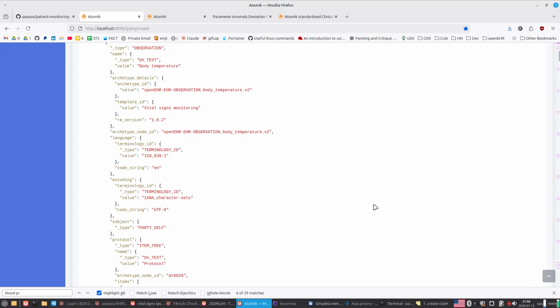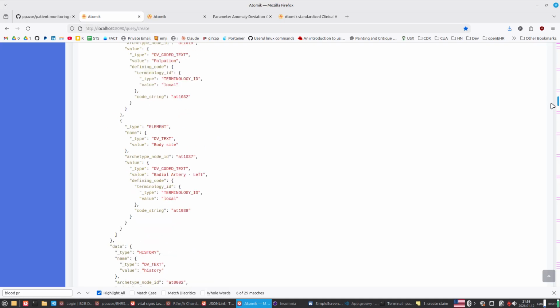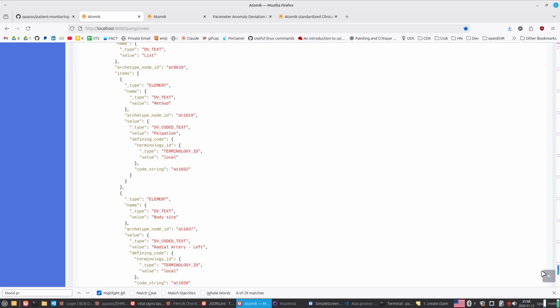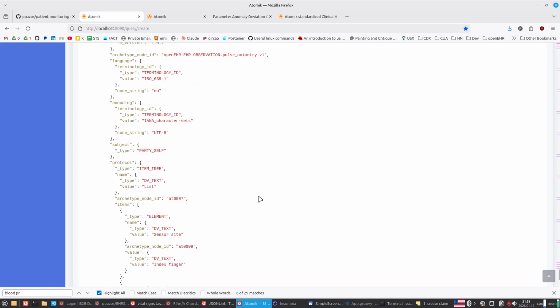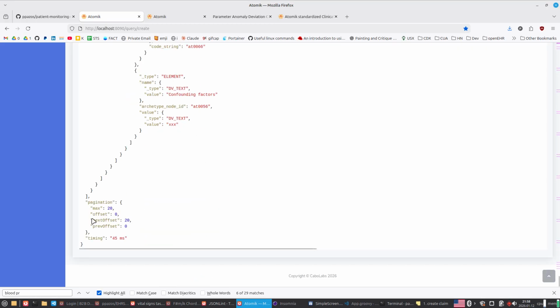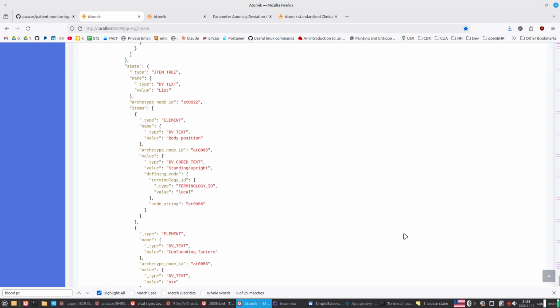And here you will see the same number of documents as we got from the summaries, but it is the full data of each document with all the data points in there. So you don't only get the blood pressure, you get the pulse, the body temperature, oximetry, etc. in all the documents. It's the whole data, the whole context. And it took almost the same time, because for doing the query in the database it is the same logic. Then it's just reconstructing these documents so you get the data back.